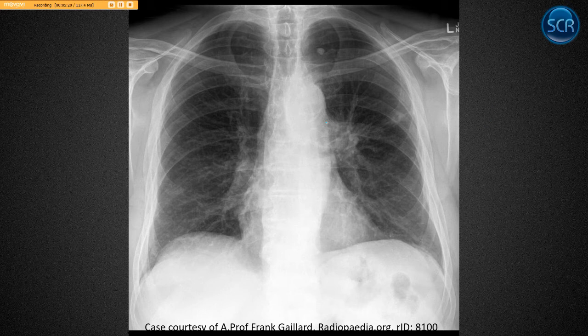All right, in this case, we see a left hilar mass. It's a little bit more prominent. It should look more like the right hilum. So this person has a hilar mass, and has a little bit of some peripheral changes here. This is just a calcified, probably an old calcified granuloma from old infection. No big deal. They have some osteophytes here on the right-hand side.